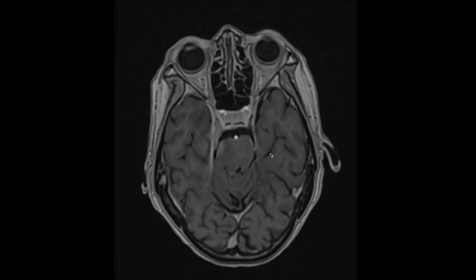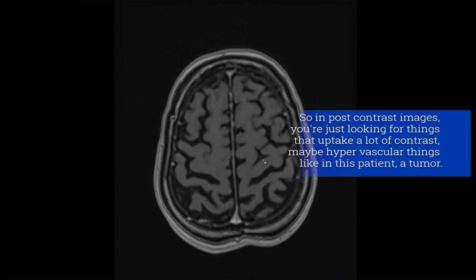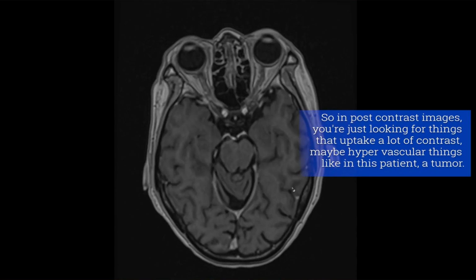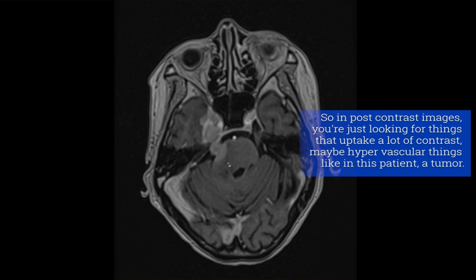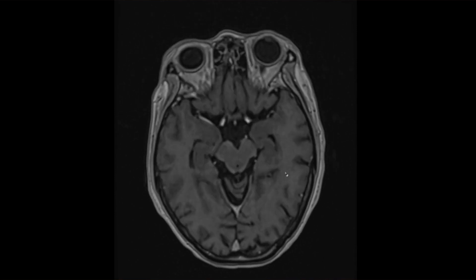During the day, but we have post-contrast images. So the post-contrast images, you're just looking for things that take up a lot of contrast, maybe hypervascular things like in this patient, a tumor. This is bright now. You might remember from a minute ago, this is not so bright. That is because it's taking up contrast.